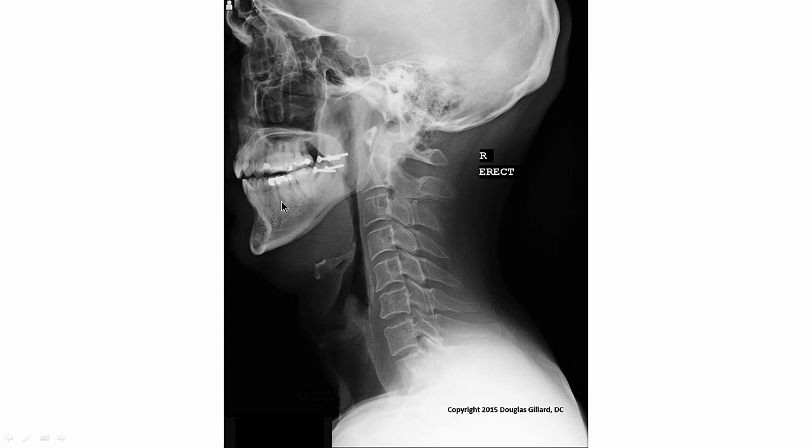If you look real close, let's start with the mandible here. So here's the body right here, here's the teeth, and if you look real close, you can see there's one side of the mandible. That's the right one, that's close. It's a little smaller, so it's closer to the film. So there's the right one, and I don't expect you to know right from left here, but there's the left one. It looks a little bit fatter, so it's a little magnified because it's farther away from the film or the cassette. See that? But they're superimposed.